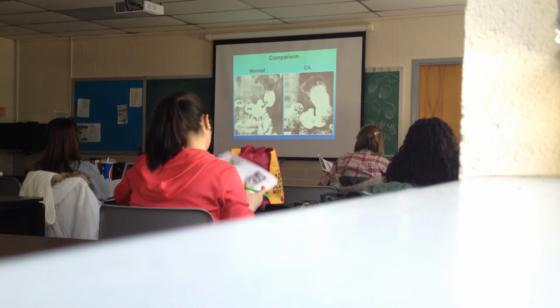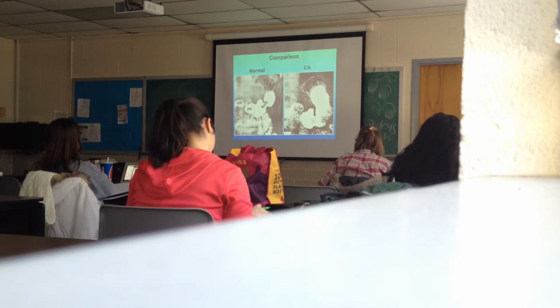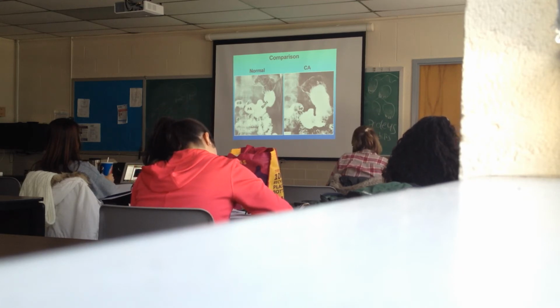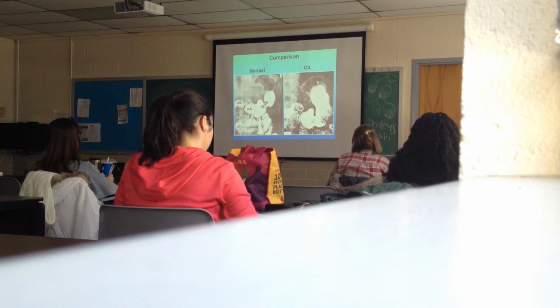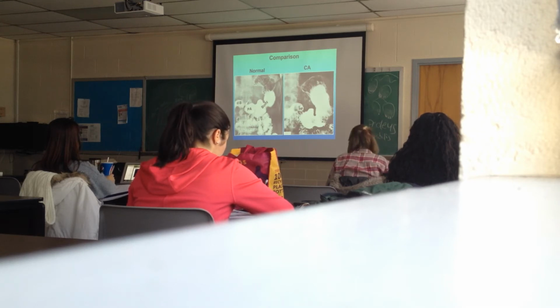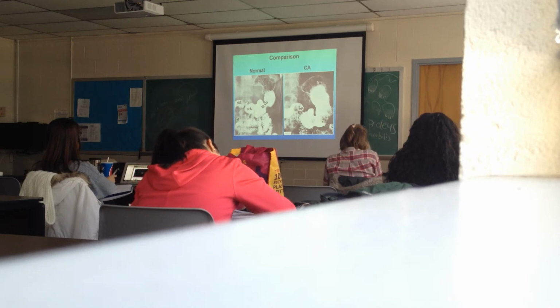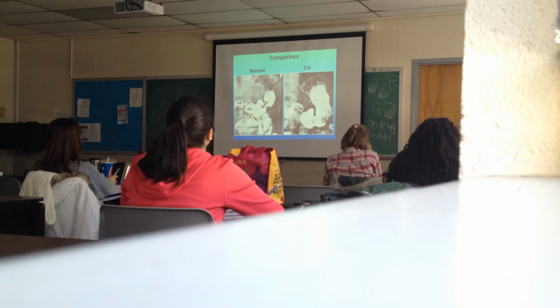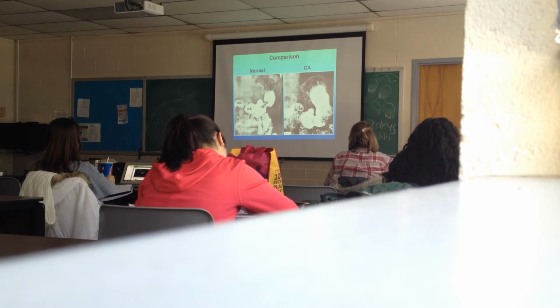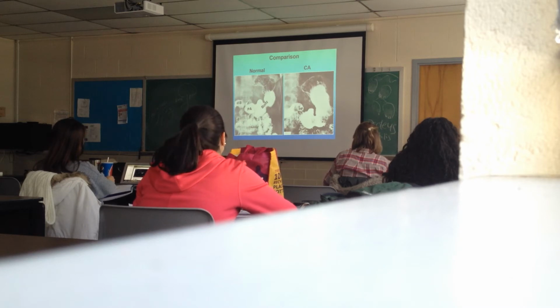We have here one example, the radiographic appearance of a gastric cancer. Gastric cancer can appear in many different ways. This is the way an exophytic mass will appear. Exophytic, X is going out, is going as a protruding mass. Again, we've got normal over here for comparison: corpus, antrum, and duodenal bulb. Again, you can see the corpus, the antrum, duodenal bulb here.